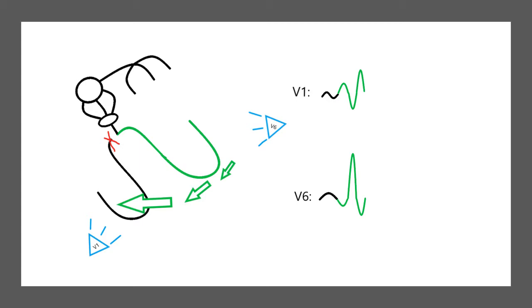And then you have a small S wave in V6 because that late depolarization of the right ventricle is occurring after the left ventricle is already depolarized, and that electrical activity is coming back against itself, cell to cell through the muscles, to hit the right ventricle. And since that depolarization is now moving towards V1, that's going to be reflected as an upright R wave in V1. In this case, it'll be R prime again, because it is a second R wave, and an S wave in V6.